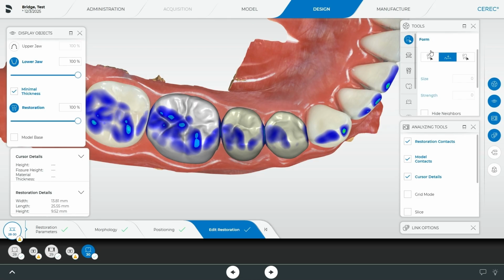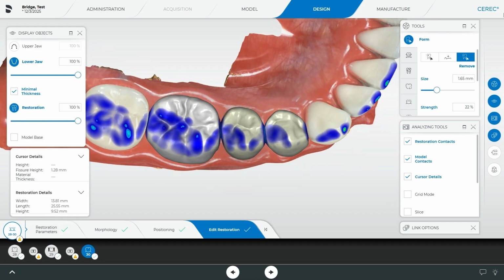You might come through and remove some of this just a little bit, maybe lighten where these are, considering that you had to lighten some of it for what's there. I kind of like the one that was in there, so I might add this one just a hair. So we've got the spot that's here, and maybe lighten this back one.